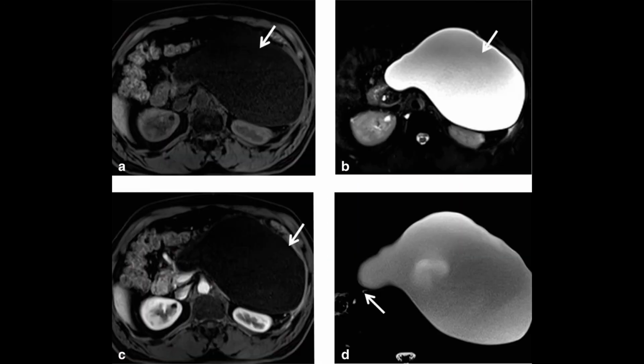So till now, whatever we saw were all solid tumors. Now in this image, what we can see here is a T1 weighted image, a T2 weighted image, a post contrast image, and here there is an MRCP. On T1 weighted image the lesion is appearing very dark. On T2 weighted image it is appearing very bright, a cystic looking tumor. But how do I confirm it? Do a contrast enhancement, no enhancement again. So it confirms that it is a cystic tumor.